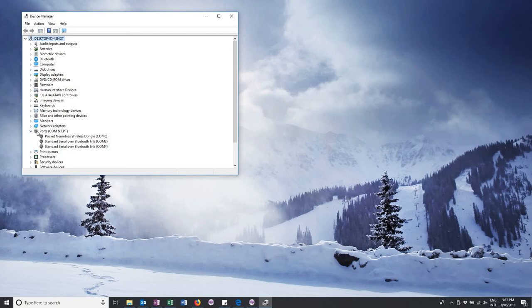In this instance, it has not done what I wanted it to do, but that's okay. So theoretically, if I was to plug it into a different USB port, we would get a different number here, so it would say COM5 or COM2 or 3, whatever, you would note that, and then you would change the setting that we just changed within EEGer.